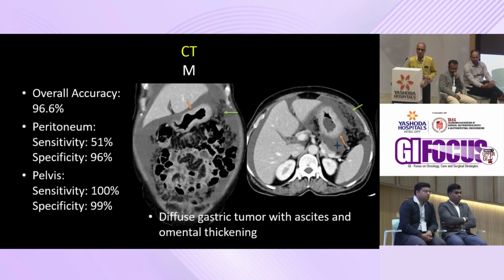Now coming to metastasis in the abdomen, two important sites are the liver as well as the peritoneum. So in this patient, you have a Linitis plastica type of tumor, small in size, diffuse disease, extensive ascites both in the supramesocolic and in the inframesocolic compartments. Also notice the presence of fluid in the lesser sac.